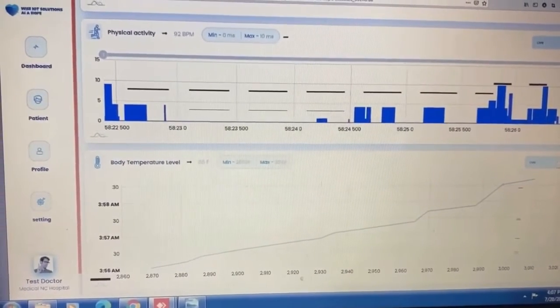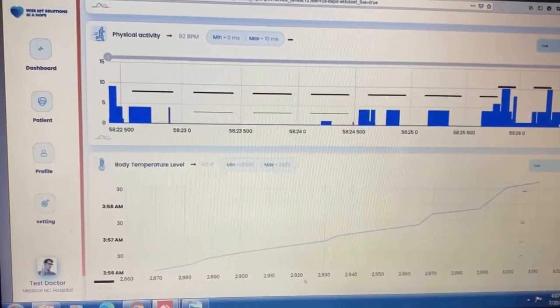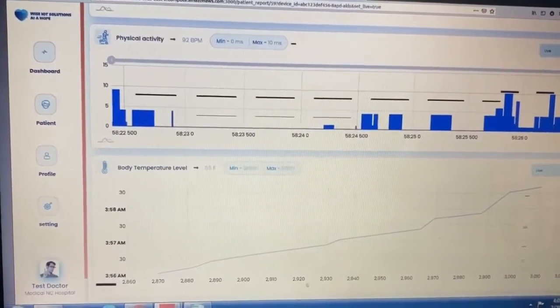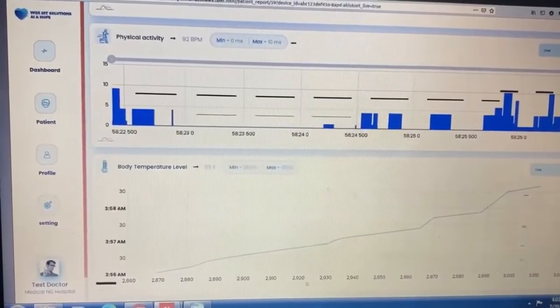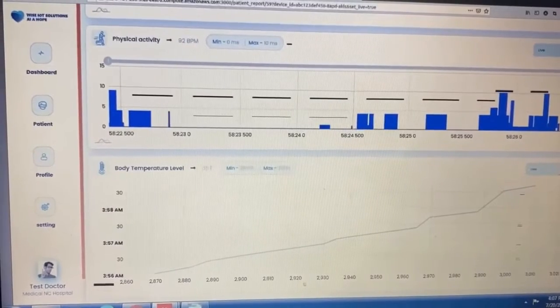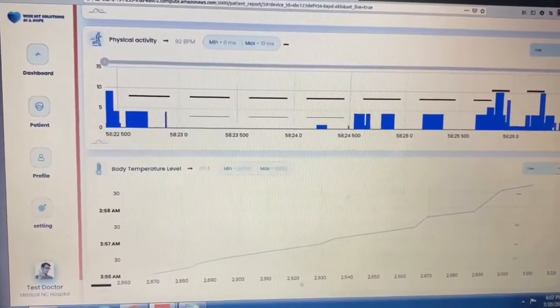So basically on UI, doctor can monitor live data of the patient health in the form of reports and graphs in the system, which consist of active readings in real time, or can say that the actual readings in real time.